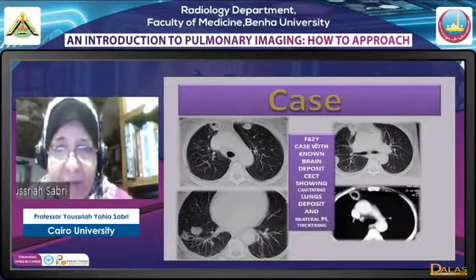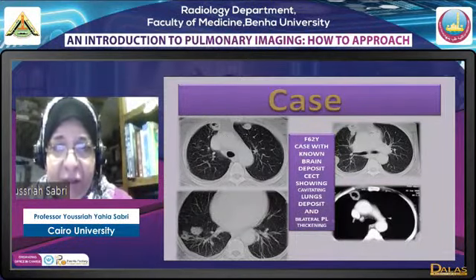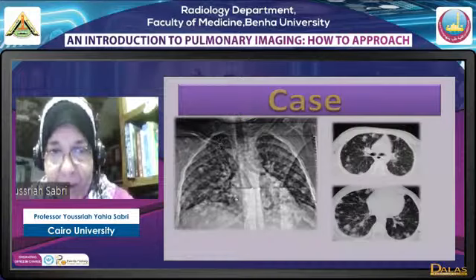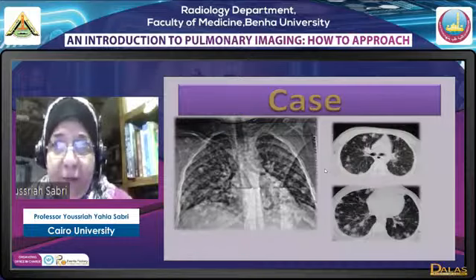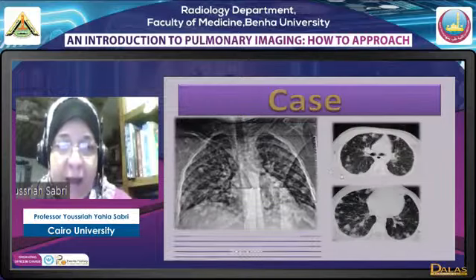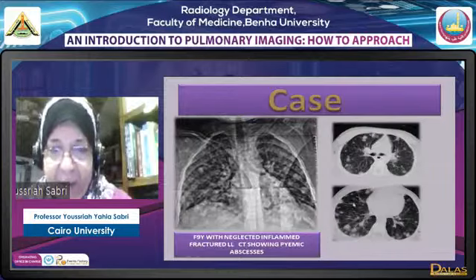Actually, in this case, it was a female 62-year-old with brain deposit. They were looking for primary, chest CT was done and it didn't find a primary, but found metastasis with cavitation, as you see. Now here we have numerous, not countable, bilateral nodules and some of them showing cavitation, and showing angiocentric sign. Here we have the possibility of metastasis versus an inflammatory or infectious process.